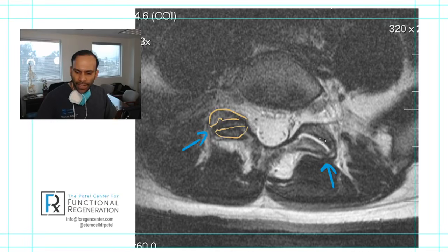But on this side, on the left side, even though the margins are relatively smooth, right, and the buns look pretty good, we're seeing instead of hamburger meat, this is just straight up a cheese sandwich, right? This is all white in the center here. And I think that it's fair to say that there's a clear difference between this side and the other.